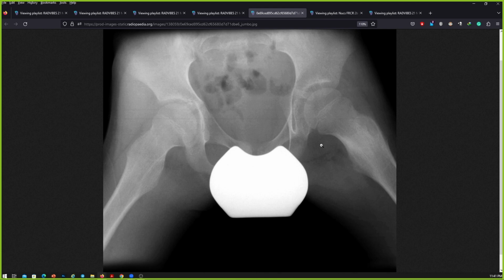In the left femoral head, it appears to be radiolucent compared to the right femoral head. That could be due to the projection. Yeah, could be due to that. What else do you see? I can see there is a radiolucent lesion involving the cortex of the left proximal metadiaphyseal region. The lucent lesion has a well-defined sclerotic margin. I am not able to appreciate any aggressive type of periosteal reaction, and there is no soft tissue swelling.